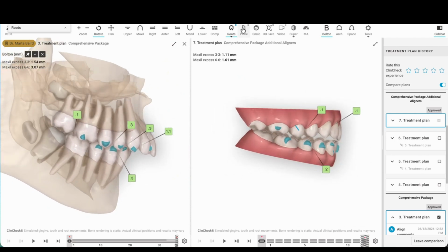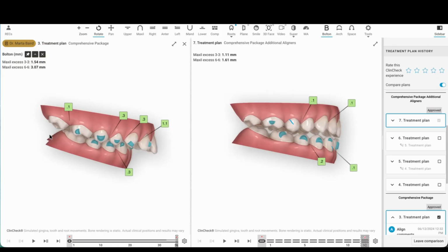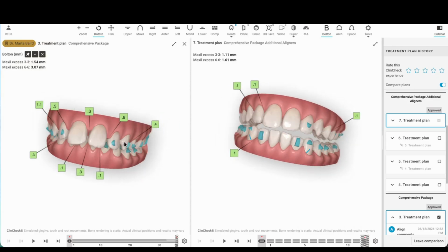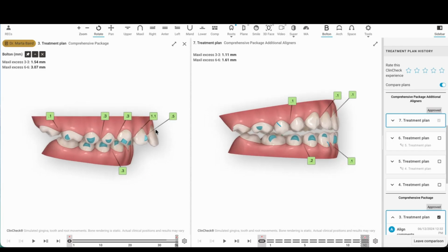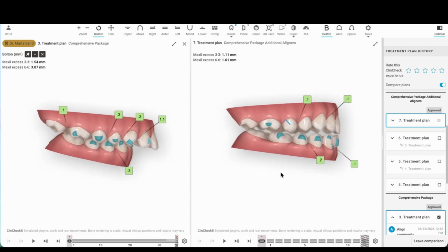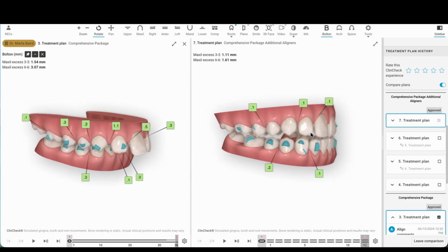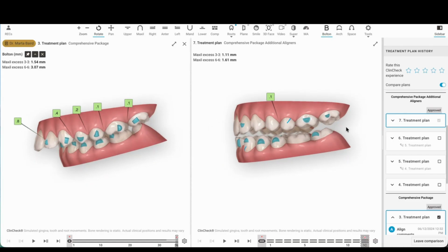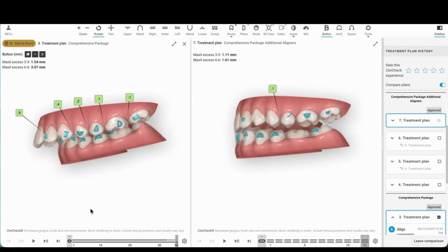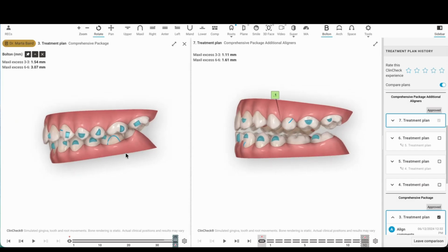And when you think about how the aligners were cut, is it possible that the second molar hyper-erupted because it wasn't included in the additional scan? That's absolutely a possibility, but this was her CR. And so what I did in this series was to undo some of the dental alveolar compensations that had happened from really good skeletal growth along with some really good dental alveolar changes from a patient that wore her elastics a lot. So this is where I thought I would end up, and this is where I got.